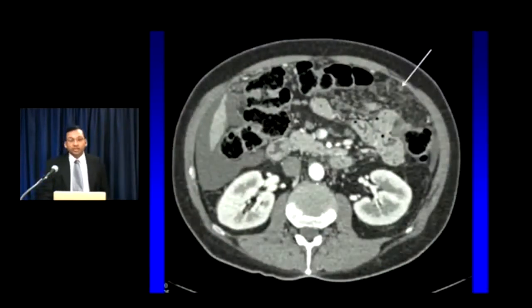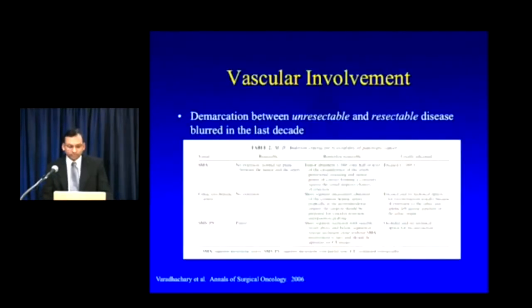Now, as I mentioned, carcinomatosis can be quite difficult, and you've got to be on the lookout for pretty subtle findings. Anytime I see ascites in a patient with pancreatic cancer, I'm going to spend extra time looking at the omentum and the mesentery. Ascites has to be taken as your #1 clue that there's something going on in the peritoneum, and you need to look carefully for any stippling, any nodularity, any unexplained stranding or induration in the omentum that could reflect the presence of an underlying pancreatic adenocarcinoma.